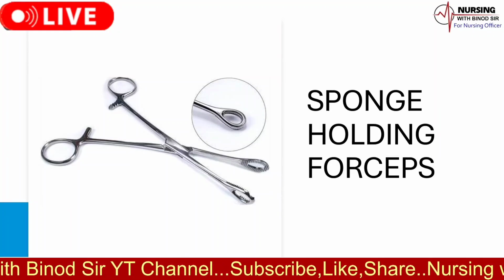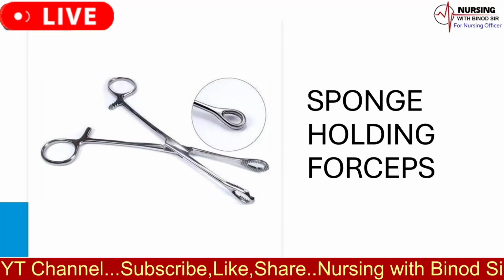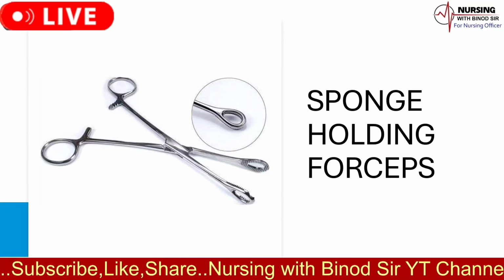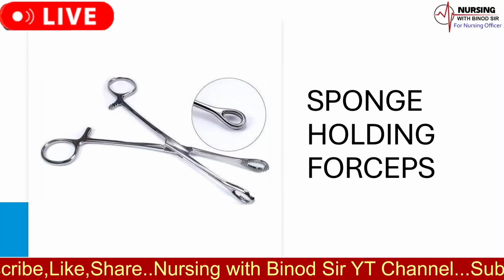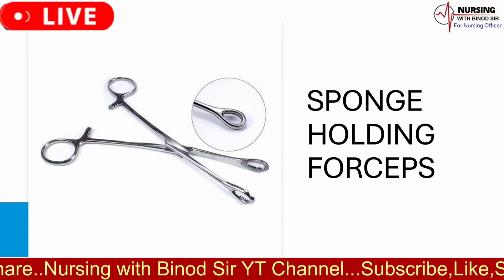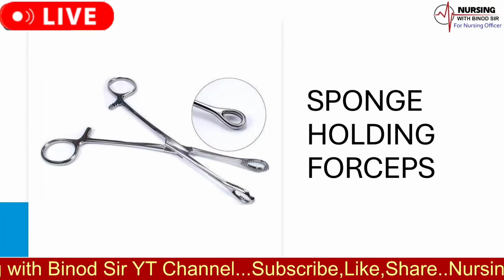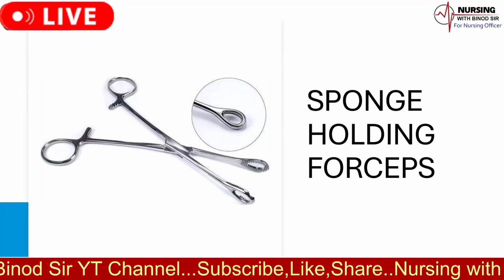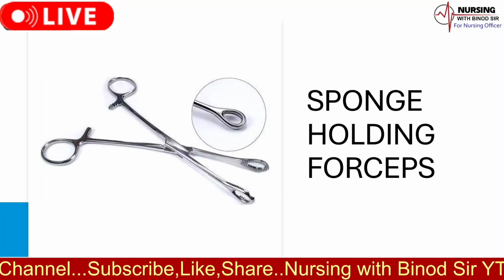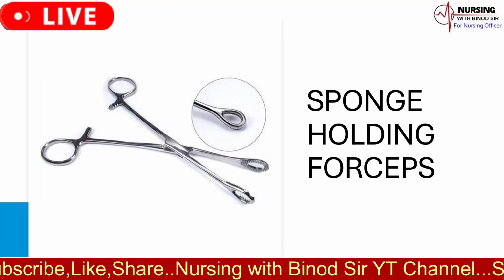The uses of sponge holding forceps as follows. 1. Toileting the vulva, vagina and perineum prior to and following delivery. 2. Antiseptic painting of the abdominal wall prior to cesarean section. 3. To catch hold the membranes if it threatens to tear during delivery of the placenta. 4. To catch hold the cervix, 2 pairs are needed for inspection in suspected cervical tear. 5. To catch hold the cervix during encirclage operation.